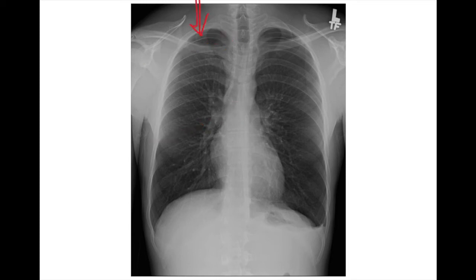B is the bones. Both clavicles appear to be normal without any fractures. You want to run from ribs 1 all the way down to ribs 12. If you could see it, in this case you're probably seeing down to ribs 9 and 10. There are no fractures or step off. The scapula appear to be in normal position. The thoracic spine, as well as the transverse process, appear to line up normally.